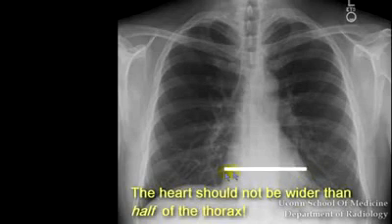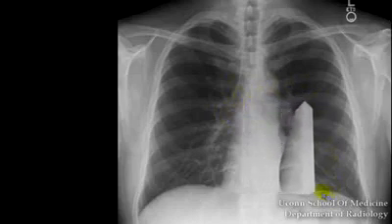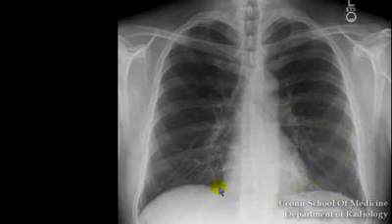The heart's widest horizontal length should not be greater than half the length of the chest. A quick method to do this is to mentally cut out the heart that lies to the right of the midline. Transpose this to the left. If the leftmost border lies within the thoracic cage, it should be okay, but if not, the heart may be enlarged.